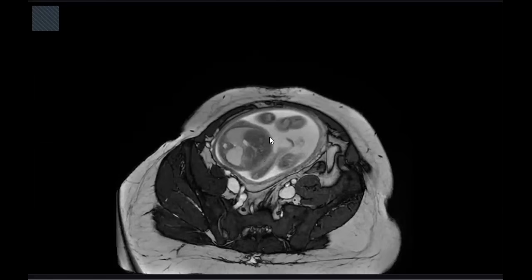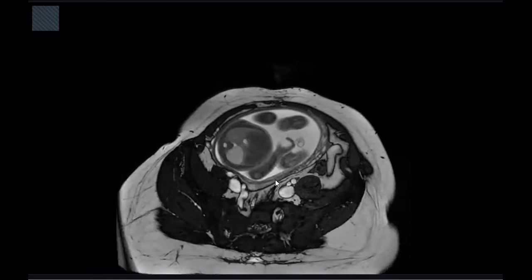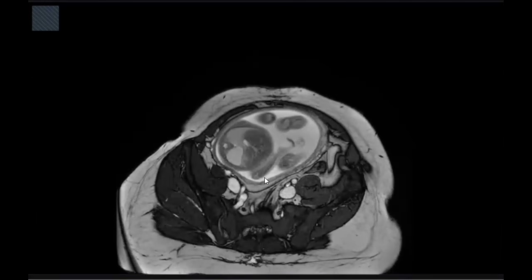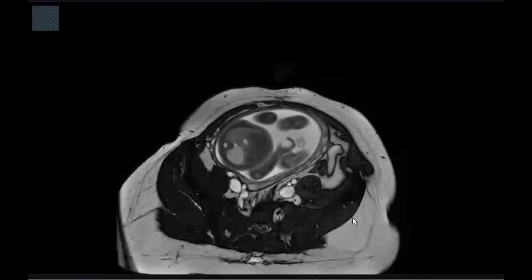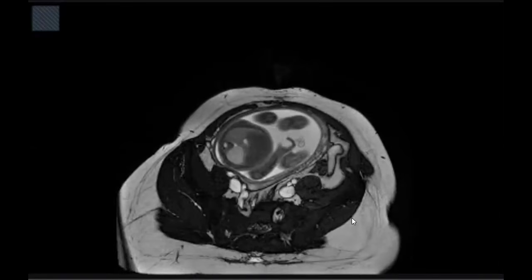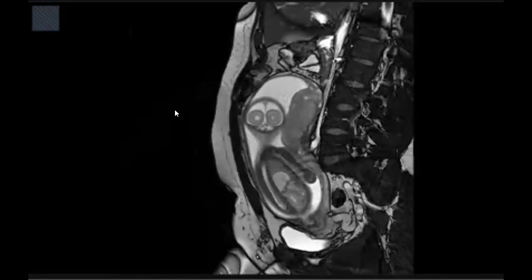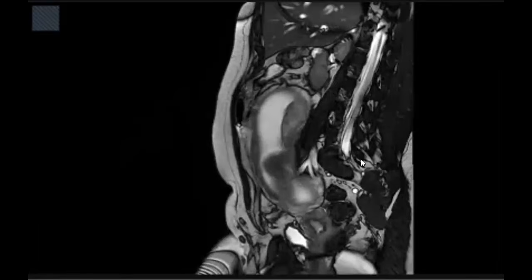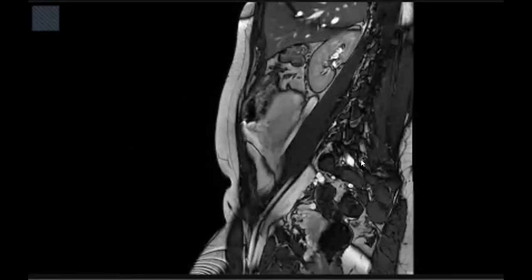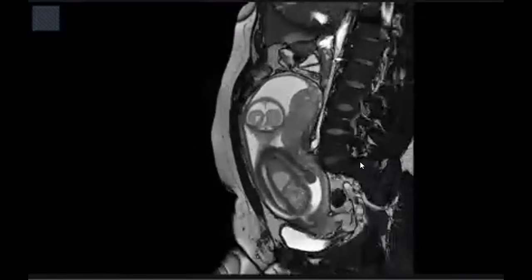This is the liver, and this is the heart. I'm trying to see the lung, and I'm assuming that this is a lesion that I can't see in the X-ray. I will try to see this. Okay, I will give you the sagittal one. Yes, please. The lesion appears high signal, seen in the left lung lower lobe.